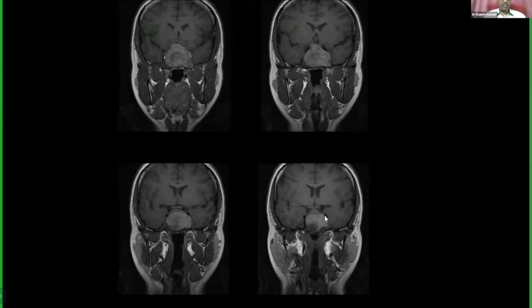Okay, so how is the lesion here? The lesion you were shown appears dark on T2, but here it appears bright on T1. So what are all the tissues which will appear bright on T1 weighted image? In T1, hemorrhage can appear bright, and high protein containing mucoceles, certain tumors.